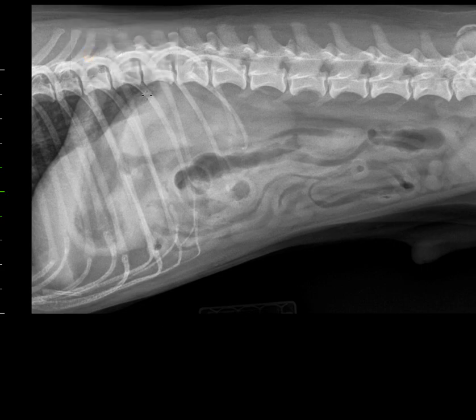I'd like to illustrate what we mean when we say gastric axis. I'm drawing a blue line to show you approximately where I would place the gastric axis in this patient. We're essentially referring to the line that follows the gastric body on the lateral radiograph. The normal gastric axis in dogs has been described as being either parallel to the ribs or perpendicular to the vertebral column. So a line something like this would probably be the expected normal gastric axis in this patient.